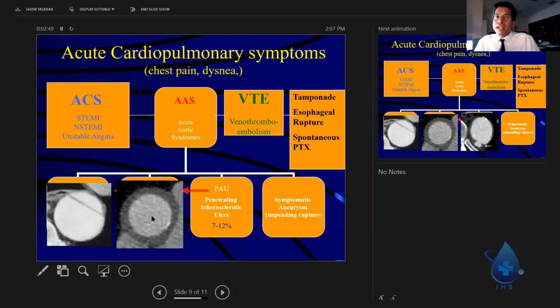It's a tough one because you'll miss it from an imaging standpoint because it can be subtle, and cognitively we'll call it atheroma. Imagine if this thickness is only 2 or 3 millimeters, you may not be able to tell the difference. If that's the case, then you put that patient in the hospital, err on the side of caution, and get another CT scan in 6 hours, 12 hours, 24 hours, 48 hours, and look for imaging evolution. What do I mean by imaging evolution?